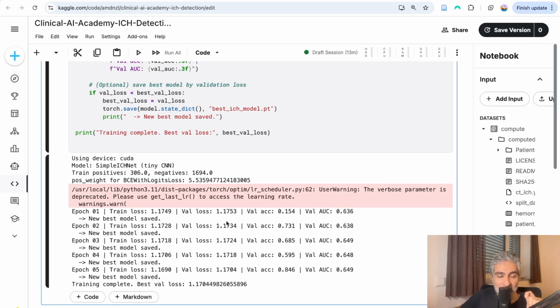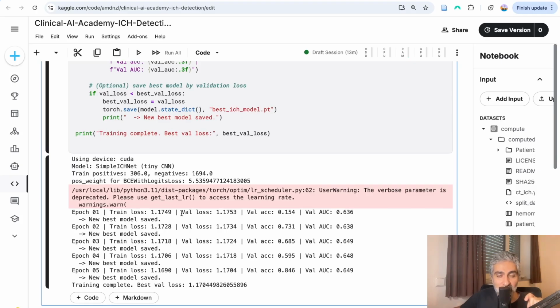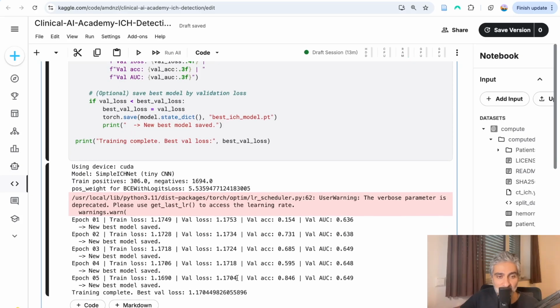Let's go through it. It's interesting. Let's look at the validation loss. We want it to decrease. It is decreasing, but not a lot. We don't worry about the training loss. It's okay. You can see it's also decreasing, but the validation loss is where you're testing on a portion of the data that the model does not see while it's training, and then we see how it performs.